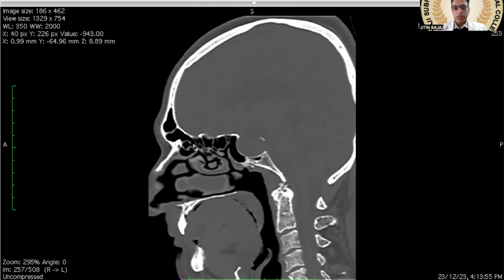If we want to reach the frontal sinus, as in a case of CSF rhinorrhea, we take a 70-degree scope and a J-shaped curette, and break the agger nasi and the frontal cell. Then we can reach and see the frontal sinus and see where the leak site is. Another important thing is the presence of supraethmoidal air cells. These are also important because the skull base is very thin here, and without knowledge, we can damage the skull base and cause iatrogenic CSF leaks.